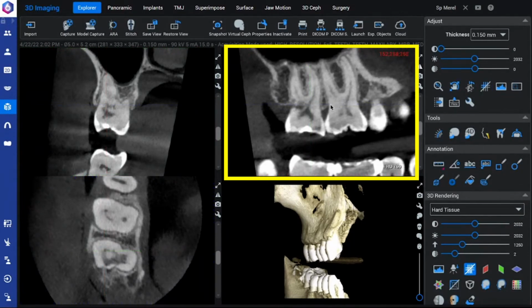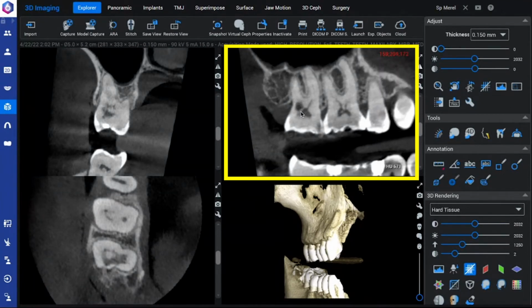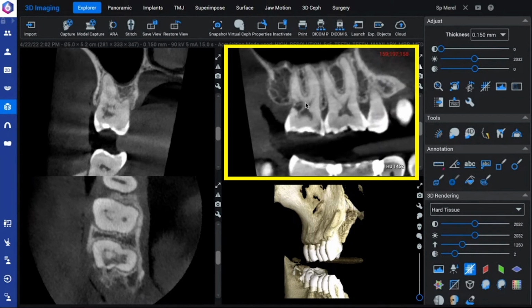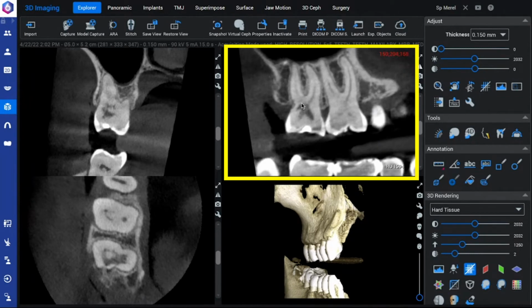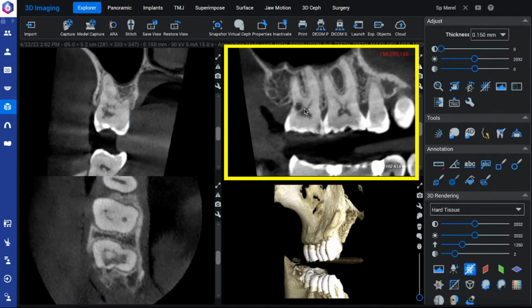We can turn off the crosshairs to better take a look at it. It starts in that distal cervical area. It invades the dentin all the way to the pulp, but stops right at that pulp sheath we were talking about, so we can see that protective layer right here. We can then see that protective layer even along the canals a little bit, so it's not necessarily going into the canal system. Again, there's that protective layer.